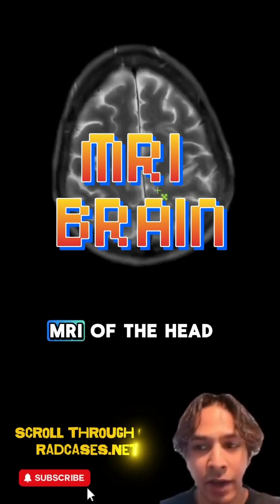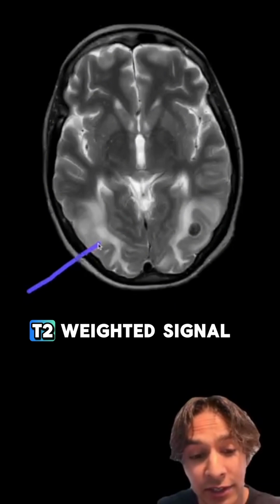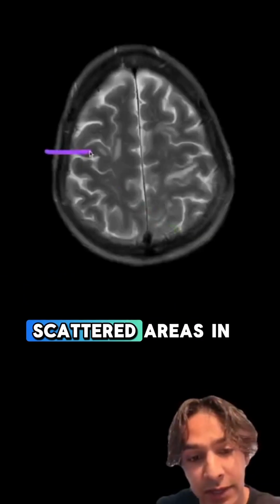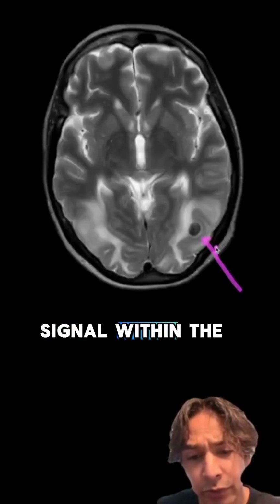So let's take a look at a case of an MRI of the head. So here we've got T2 weighted sequences. So we can see that there's hyperintense T2 weighted signal within the bilateral parietal occipital lobes. There's also some scattered areas in the frontal lobes. There's also this well-defined area of low signal within the left occipital lobe.